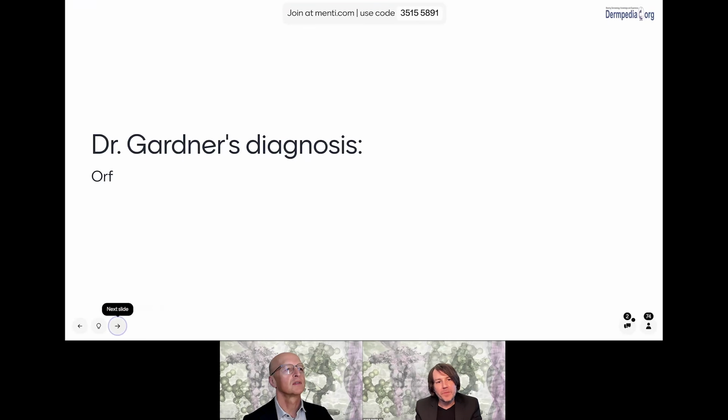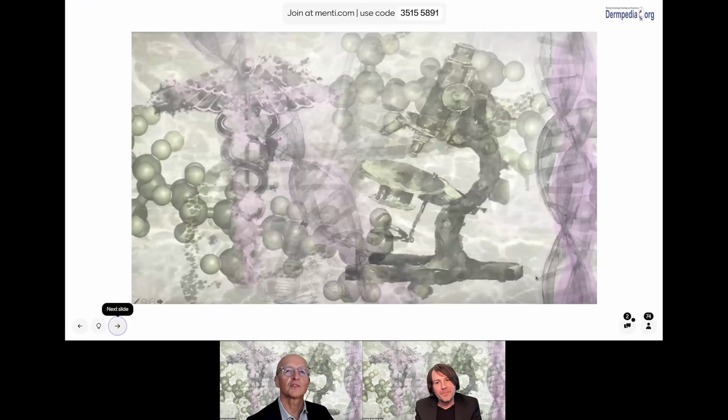Yeah, wonderful. I think that really expanded my differential diagnosis, because I wasn't that familiar with that pseudoepitheliomatous hyperplasia. No, it's so extreme, right? And the vascular part too. When I saw this case first, I didn't conceptually know that they could be that must be the late stage. The virus, I think, is almost gone. Yep, just kind of a residual process.